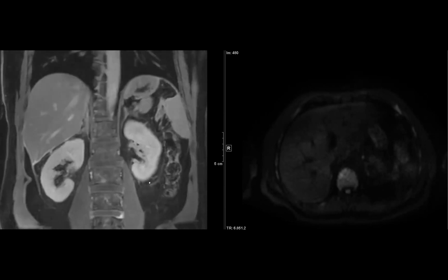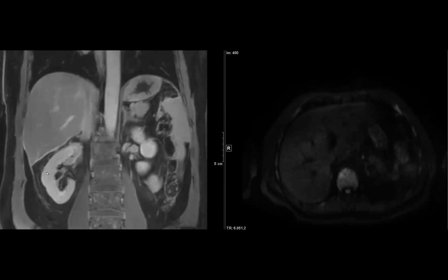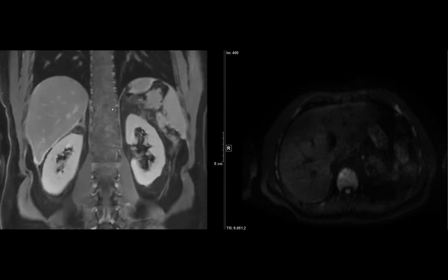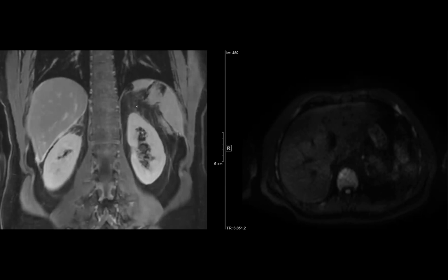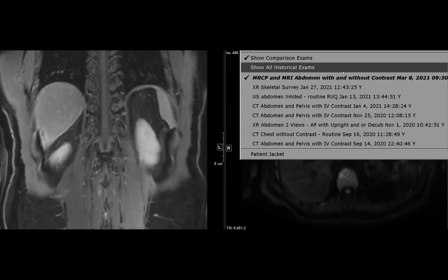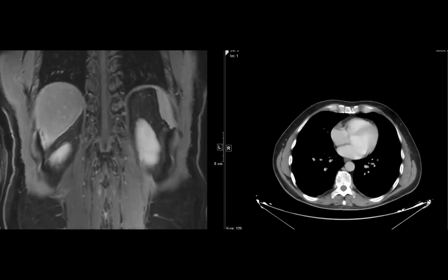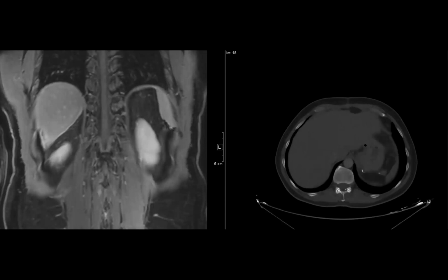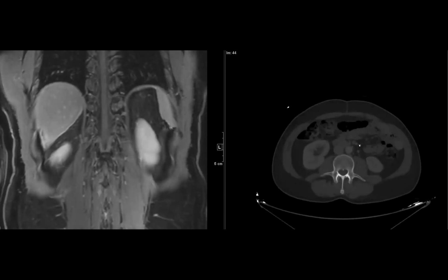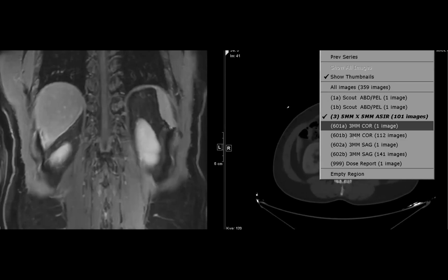So it's a very unusual case in the sense that clearly there's a lot of disease. There's bone mets, which they suspected because the alk-phos was elevated, but they were never able to demonstrate the mets because the recent CT was normal. Right there. So you can see that the CT is normal.